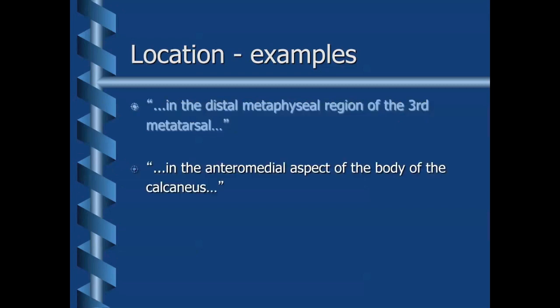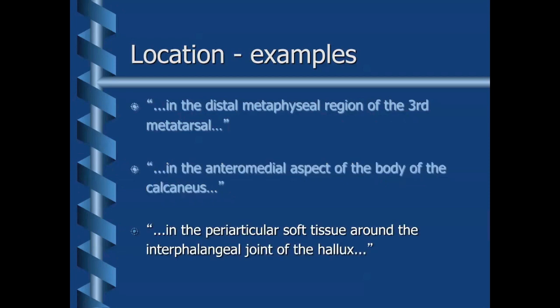Let's go for another example. In the anteromedial aspect of the body of the calcaneus. So again, talking about a specific bone, the calcaneus, and now we know to look at the anteromedial aspect of the body of the calcaneus. So very, very specific location. If you just said the calcaneus, or the front of the calcaneus, it's not good enough. It's not giving an exact location.